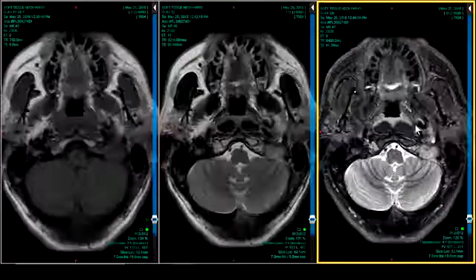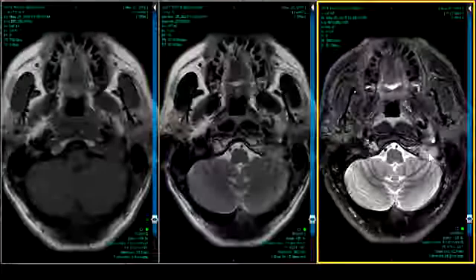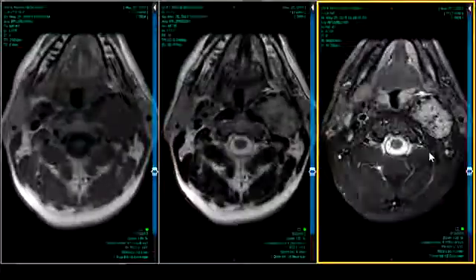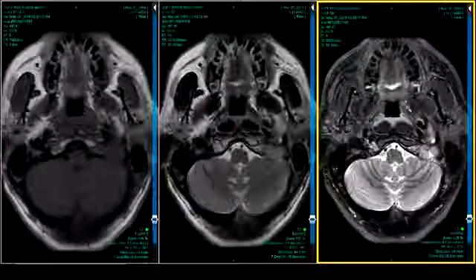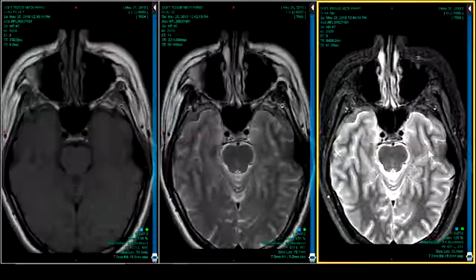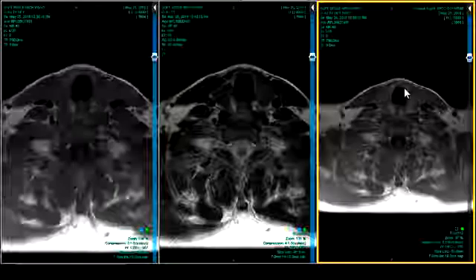Isn't there another one on the left, higher? Oh yeah, right there. Yep. There sure is. You stole my thunder, but that's okay. My thunder needs stealing. My wife will tell you that.